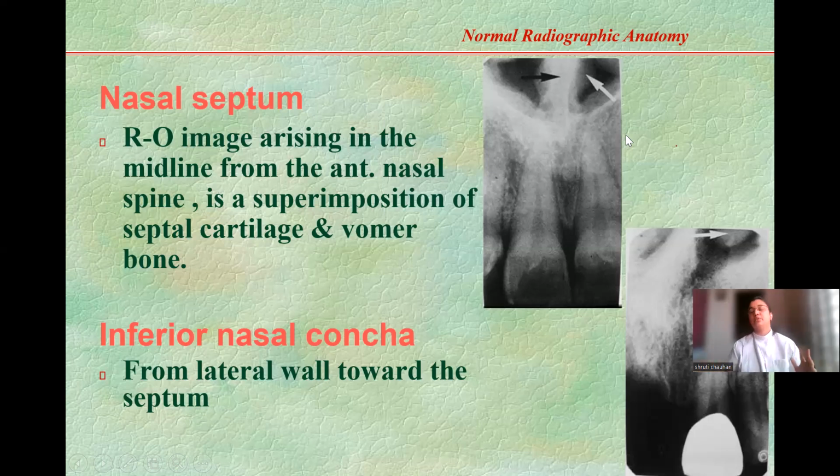Again, just close your eyes once. What was it? Black. Why was it black? It is a foramen. Normal bone है हमारे पास, एक जगह पे गड्ढा है. There is a hole at one place. X-rays will pass more through the hole or through the normal bone? Through the hole, obviously, because वहाँ पे density कम है, bone कम है, X-rays will pass more. So how is it going to appear over here? Radiolucent. Got it?